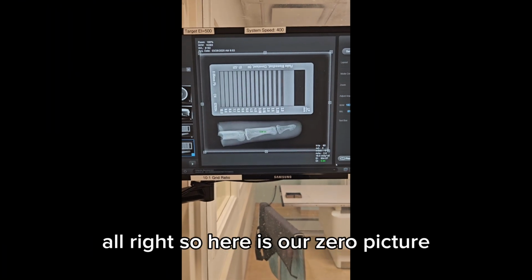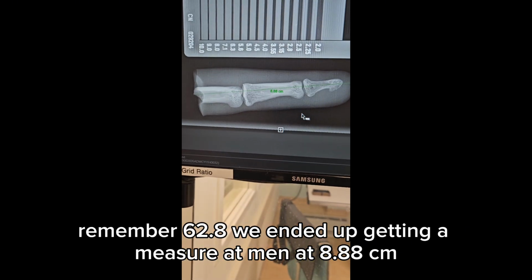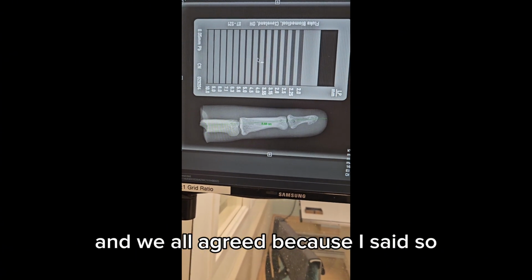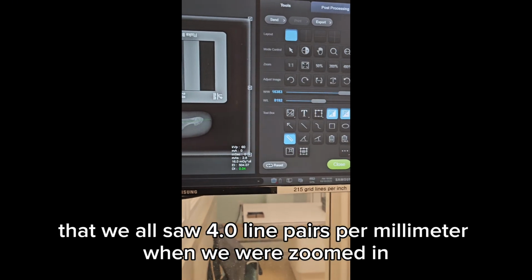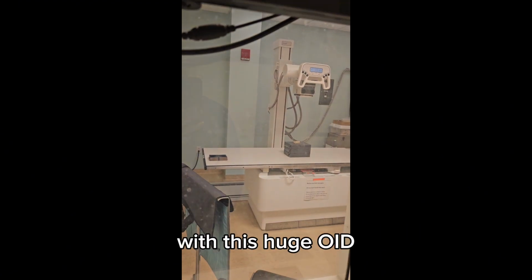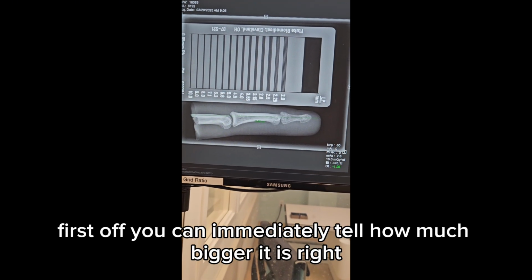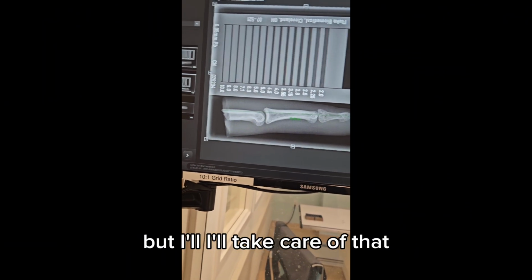All right, so here is our zero picture. Remember 62.8, we ended up getting a measure of 8.88 centimeters with a magnification factor of 1.17, and we all agreed, because I said so, that we all saw 4.0 line pairs per millimeter when we were zoomed in. So now I'm going to show you what happens when I take this picture with this huge OID. It's going to be this picture right here. Boom. First off, you can immediately tell how much bigger it is, right? Yes, it already has a measurement, but I'll take care of that.